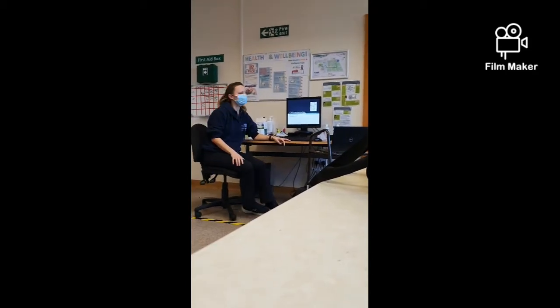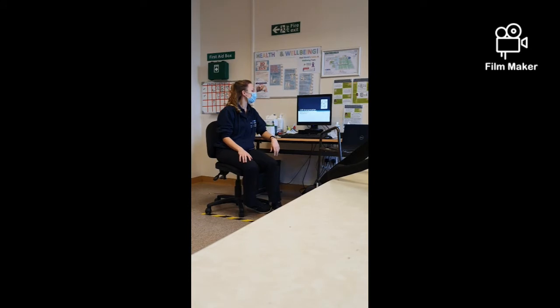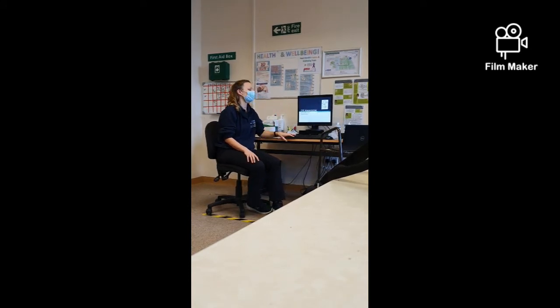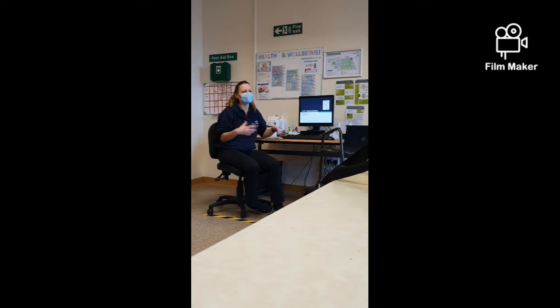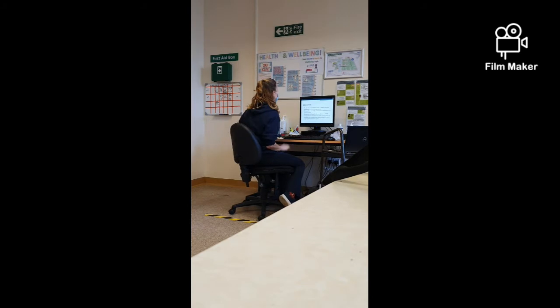Morning, guys. So we're going to have a look at chest X-ray interpretation today. We're going to go through a bit of a systematic approach of how we look at chest X-rays and interpret them. I'd be really keen if you can ask questions, and we get quite interactive as well. So just going to go through the objectives.